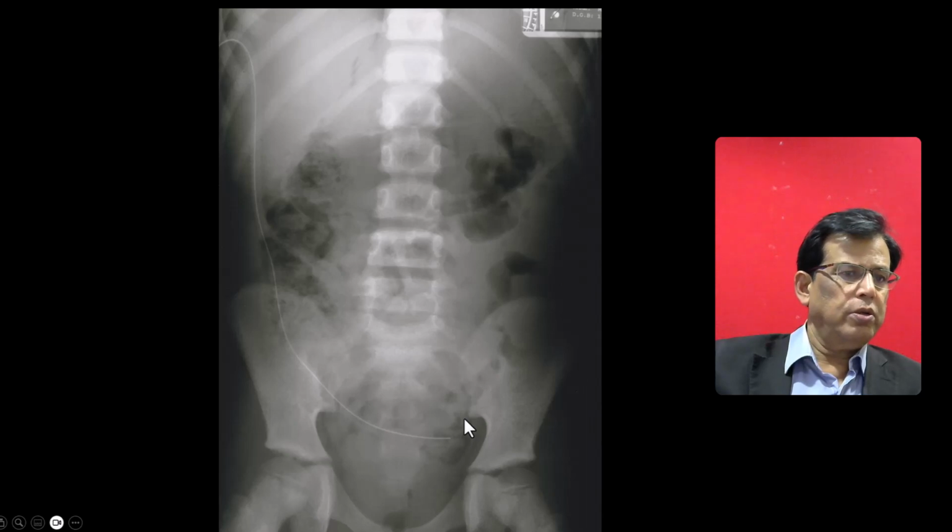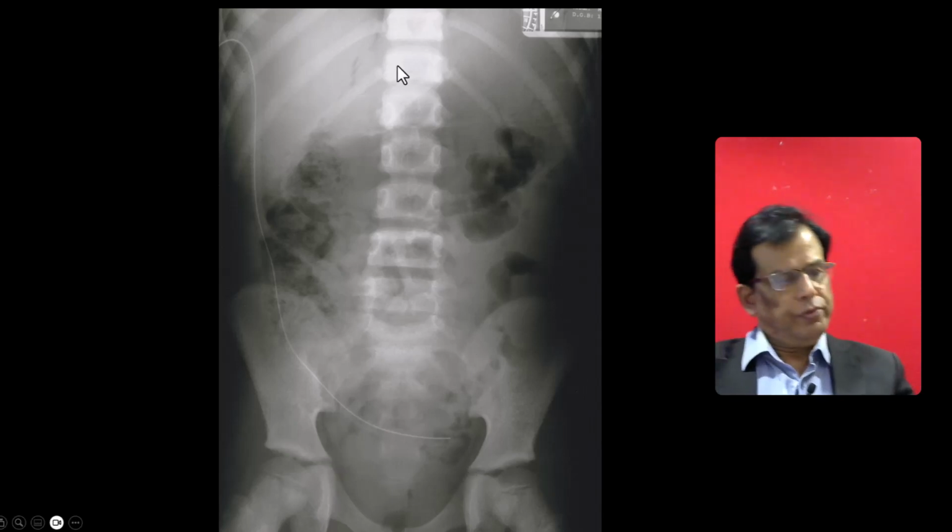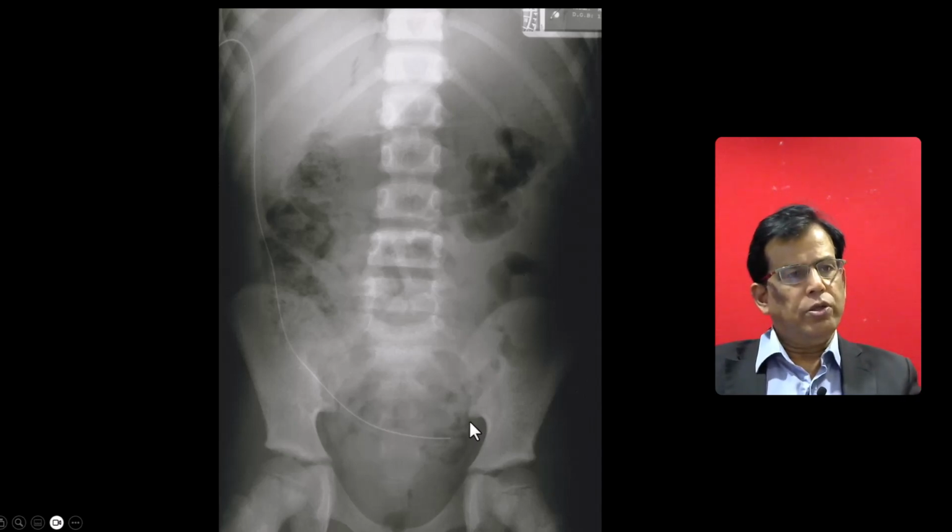What do you think about the skeletal system? Yes, there's increased density in the dorsal vertebrae, especially D12. All the bones are a bit... looking back retrospectively, I see there is increased density and generalized sclerosis of the bones. So now try to join all these things together. To compile the findings, my top differential would be hyperparathyroidism due to renal failure.